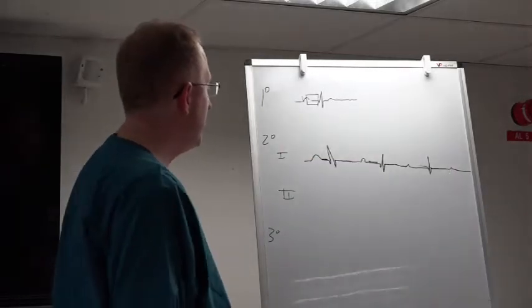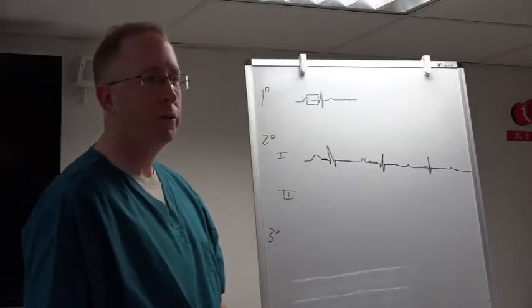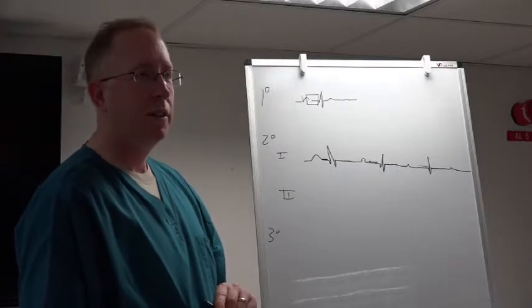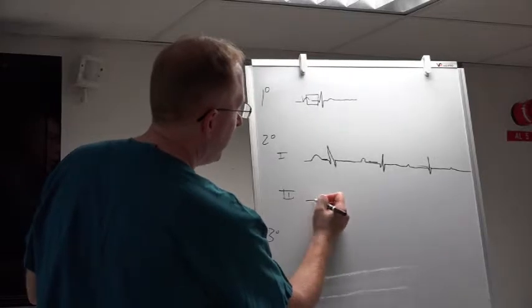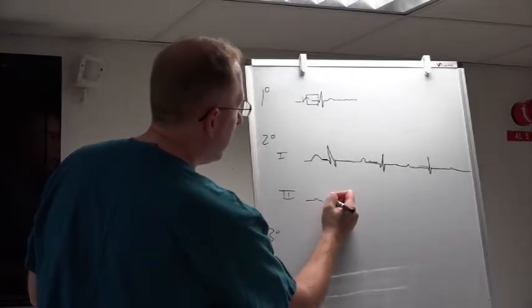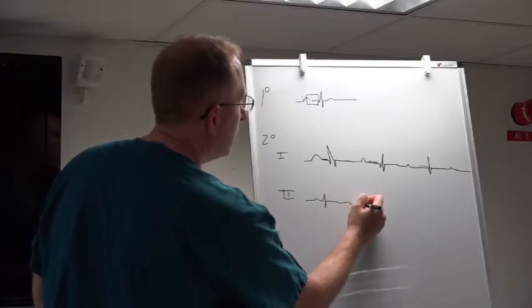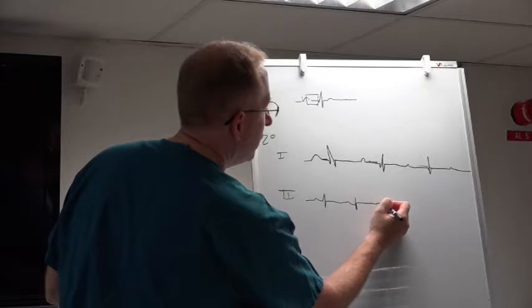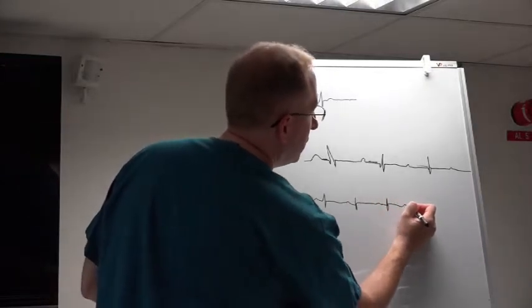Do you remember the type 2 second degree heart block? Any one of you? Anyone? That's the P wave and the T wave start to merge or look like they merge. Well, not quite. This one will look like a kind of a normal rhythm, right? The P and the QRS are fairly stable and consistent. It'll look like a normal sinus rhythm, but then you'll have a drop.